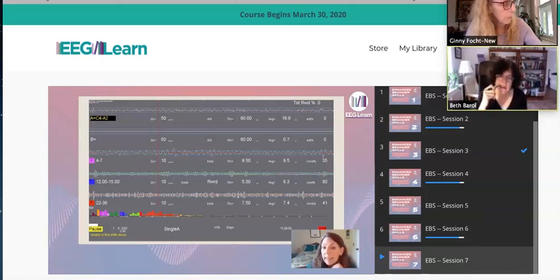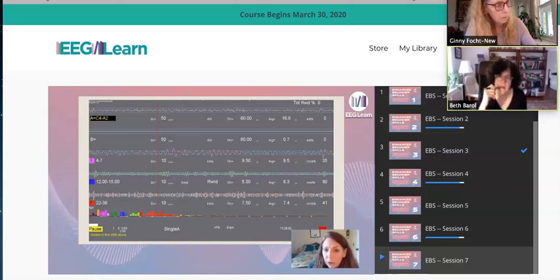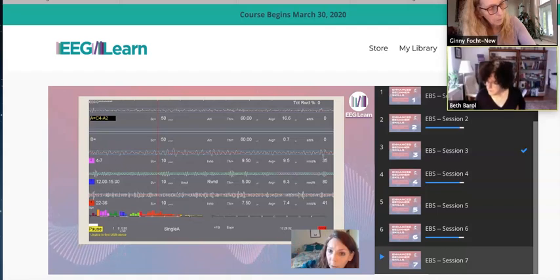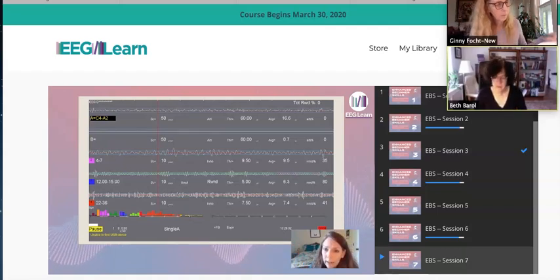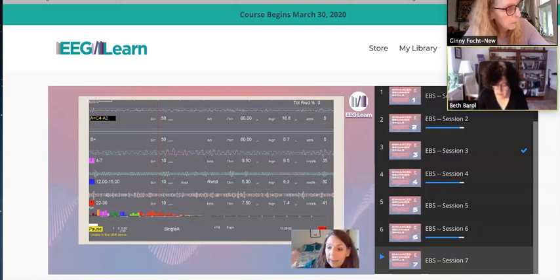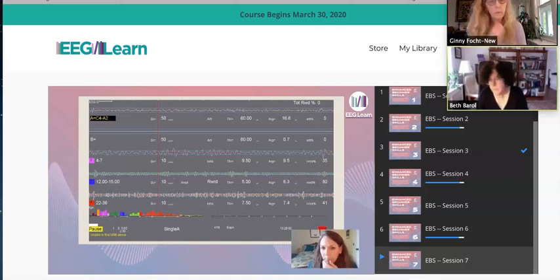Okay, so you can kind of see how, by the way, if you're going to manually adjust a threshold, what you do is you use your page down key to highlight the band you're interested in adjusting. And if you want to narrow a threshold, you use your minus key. If you want to widen the threshold, you use your plus key. And it's got to be highlighted in order to manipulate the band. And then hitting the enter key will get rid of the highlighting. So you can individually target each band.